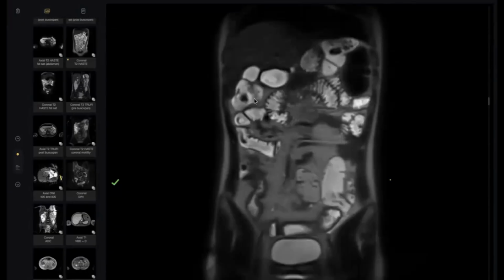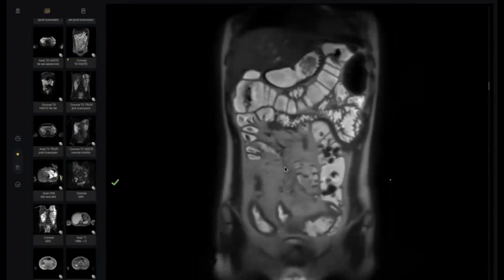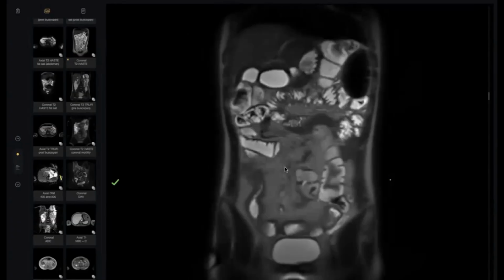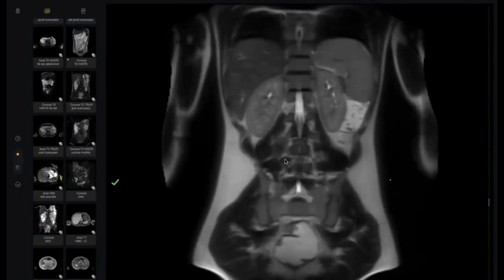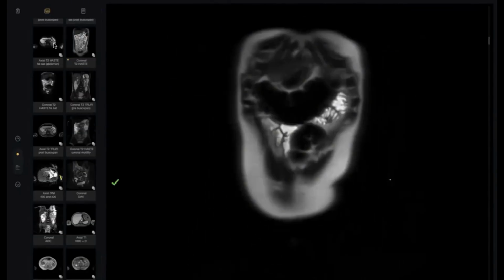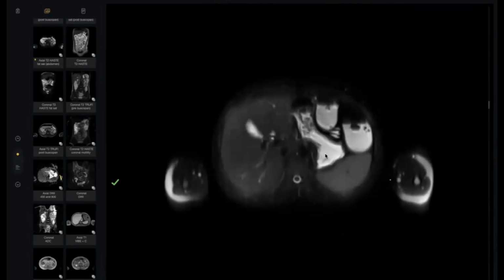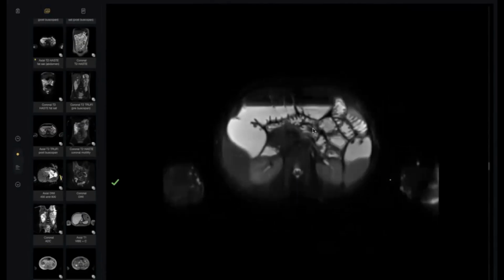When you are presented with MRE or MR enterography, number one, exclude inflammatory bowel disease. Common is common. Number two, look at the stomach and the duodenum to rule out scleroderma. Especially here in axial, I look at the stomach and then the duodenum and the folds.